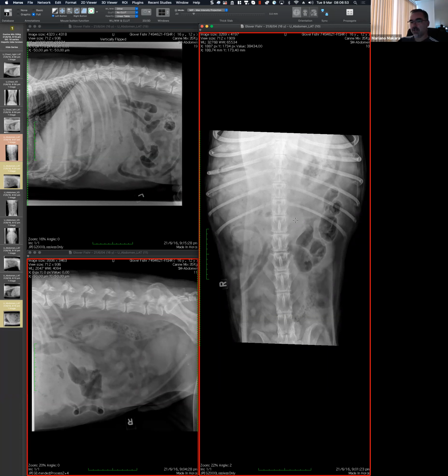I'm not saying that the dog is not sick. I'm saying the radiographs are normal. We need to be looking somewhere else. It's not an easy call. So I promise I will not bring normals, but sometimes that call is not easy. And defending that call sometimes is extremely difficult because, again, there are a huge number of diseases that are not going to result in any radiographic change. And the animal may be dying, makes sense?